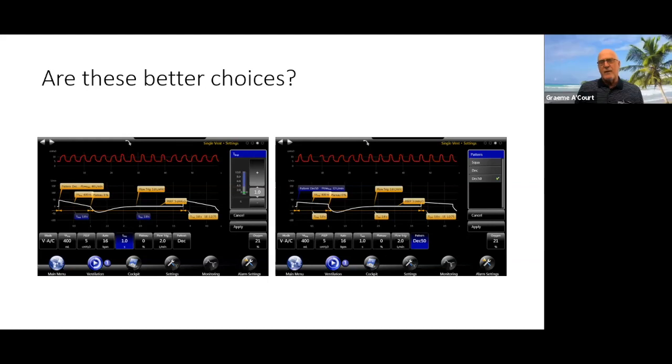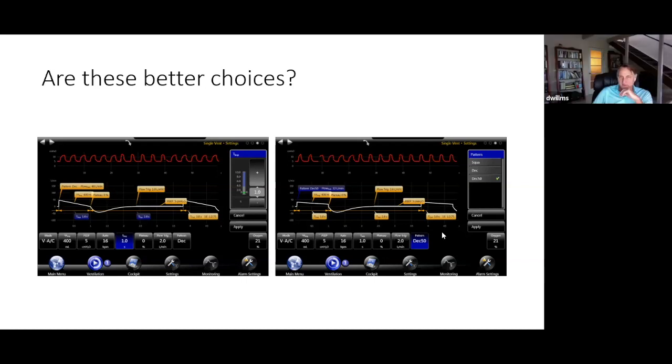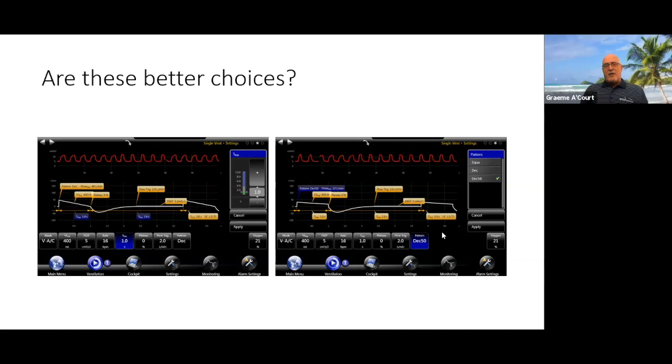That's right. But these are tweaks, right? These are tweaks of trying to... You think about it, we've got what I consider a short I time of 1 second. It's quite a short I time, right? Depends on your respiratory rate. Well, that's right. But I've done this playing with a test lung, so there's been no patient trigger or anything else. It's purely a controlled situation.